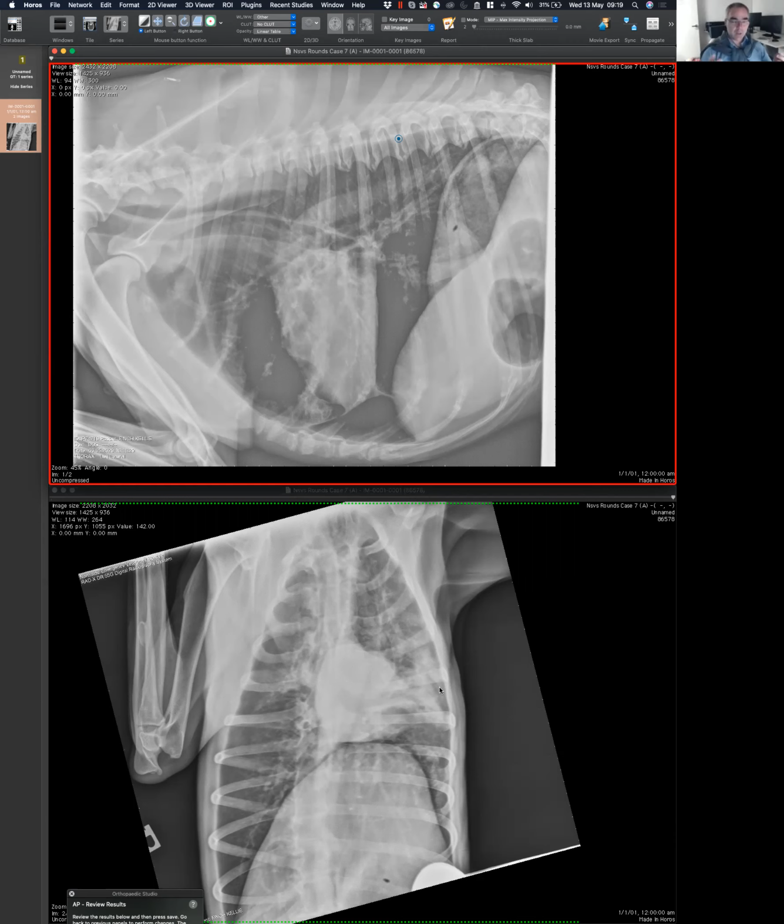Because in my eyes, it's extremely important. So if we see something in one projection, we want to see it in the other projection. If we don't, we need to try to explain what is happening. We need to at least lie to ourselves. Makes sense? We need to find an explanation. Maybe wrong, maybe right, but we should not accept it right away.